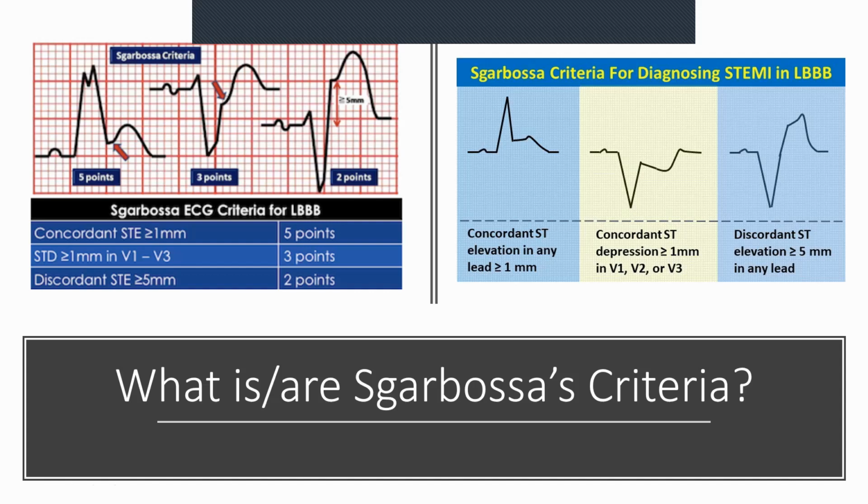So you treat them exactly the same. Now, Sgarbossa's criteria are just to help you assess the likelihood that it is definitely an acute myocardial infarction.